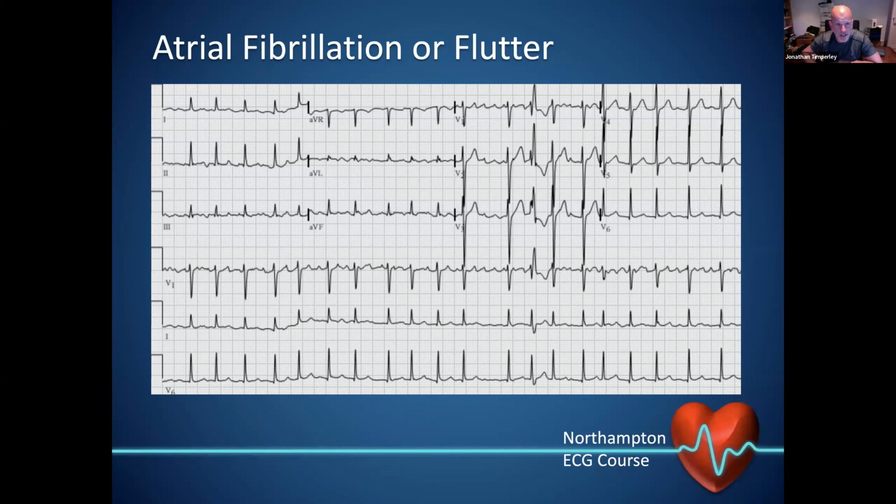So this one was just a marker to demonstrate the difference, with the potential for looking at the Ashman beats. On here you can sit looking, going, is that atrial flutter, is it atrial fibrillation, and you're faffing around trying to make a decision. The bottom line is ignore what you can see as potential fibrillation or flutter waves and go back to, is it irregular? If it's irregular, it is atrial fibrillation, full stop, end of, don't do anything else.